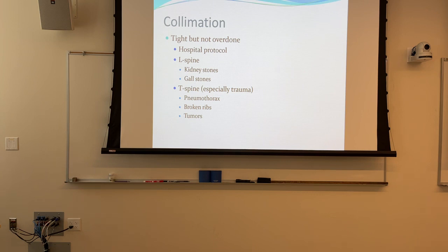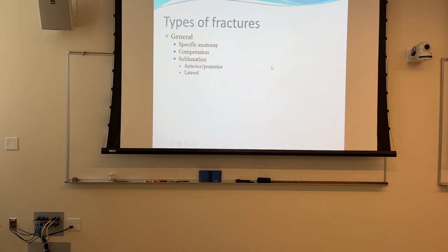So the things that you'd be looking for there would be things like a pneumothorax, and what might potentially be causing the pneumothorax, like broken ribs, tumors, anything like that. So collimation is good, but just make sure you follow the hospital protocol and the doctor's protocol.